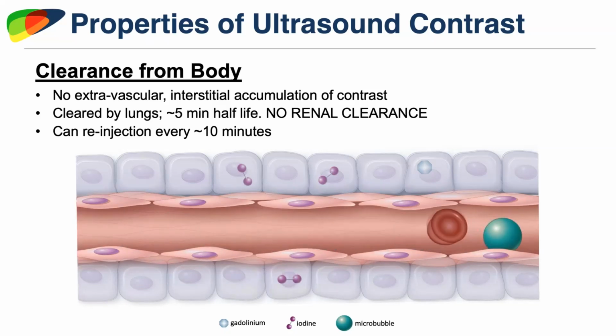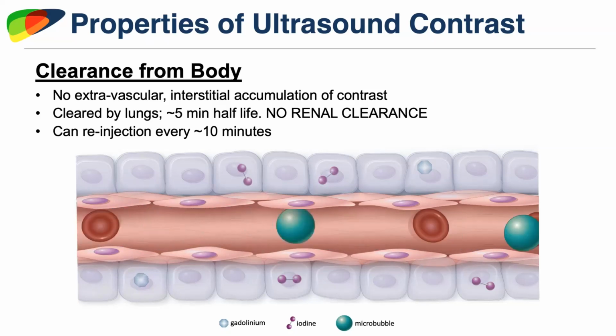It is cleared by the lungs, and you can re-inject about every 10 minutes, and there's no absolute dose limit. So just yesterday, I encouraged my colleague to use 3 vials in one setting of Lumason because she had to do a liver contrast ultrasound study to evaluate a liver lesion, another vial for biopsy of that lesion, and then the patient also came in for evaluation of a renal mass, which we did simultaneously. But by the time that they were done, all those bubbles were cleared from the system. The patient went home just fine.